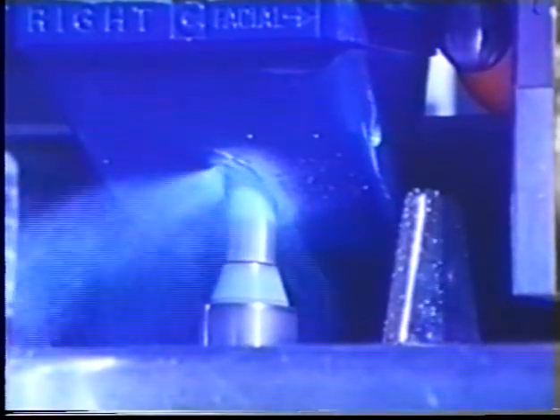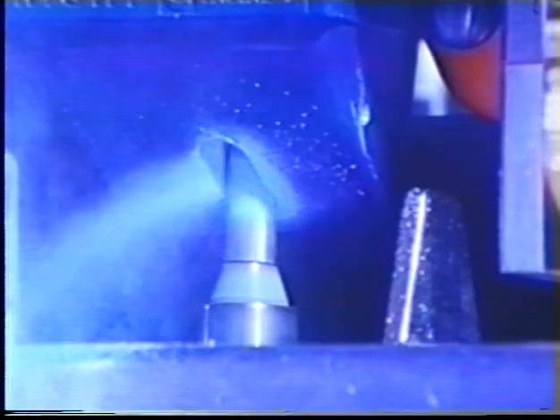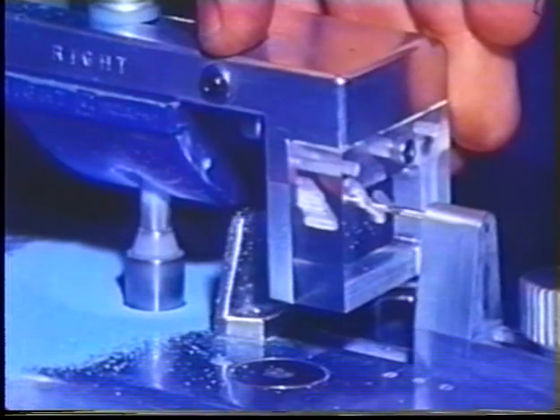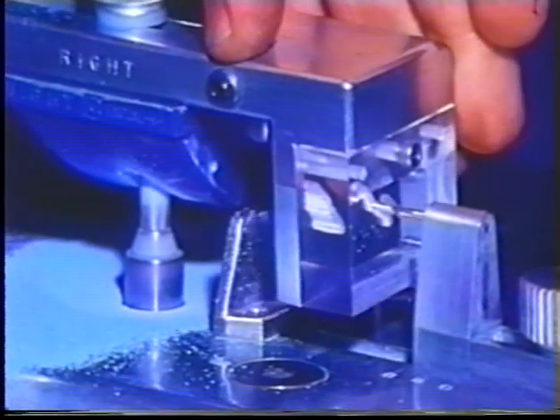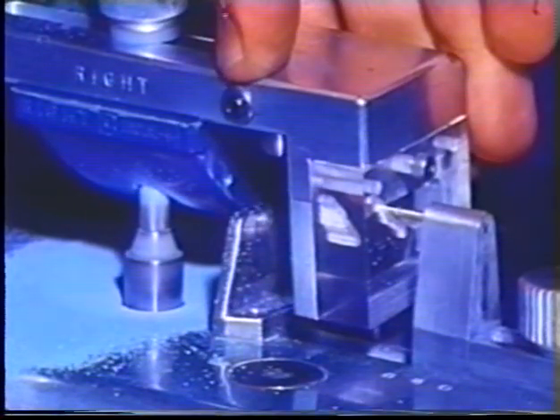Shown here is a close view of the protrusive movement being pantographed on the axis near the condyle level. The actual intercondylar distance of the patient is of no significance with this system. However, the location of these vertical analog mills is at the average anatomical intercondylar distance of 110 millimeters, which makes a convenient size articulator for practical laboratory work.